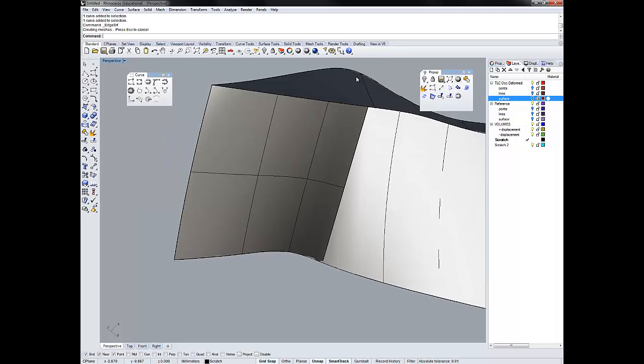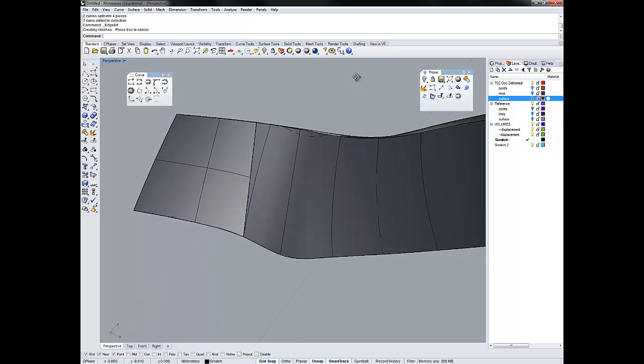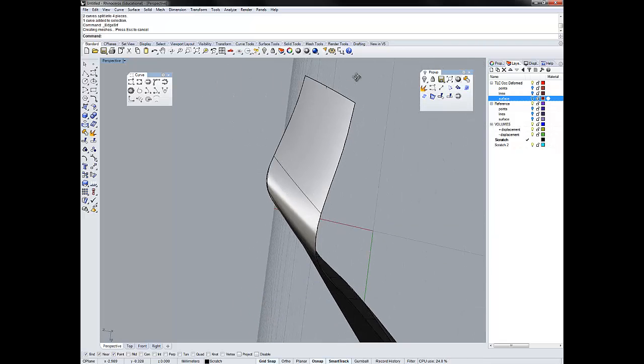So I'm going to go back a step. I'm going to further subdivide this. Delete. I'm going to add another line, and it's going to be from here up to here. And then I will further subdivide these curves. And then I will do, again, select all four of them. And select surface from 2, 3, or 4 edge curves. Looks better. You've got a little problem here, but I'm going to assume that that will work itself out.